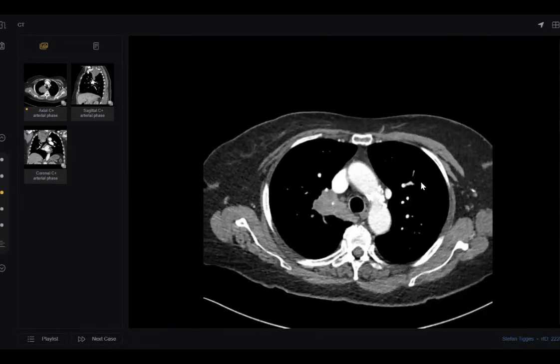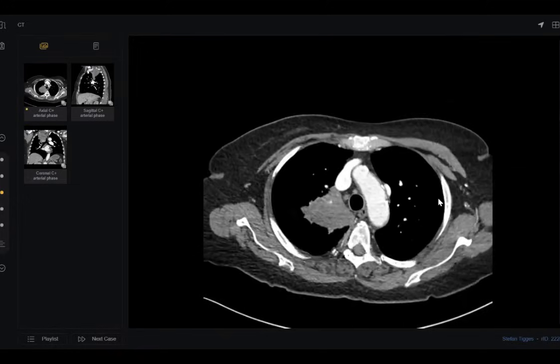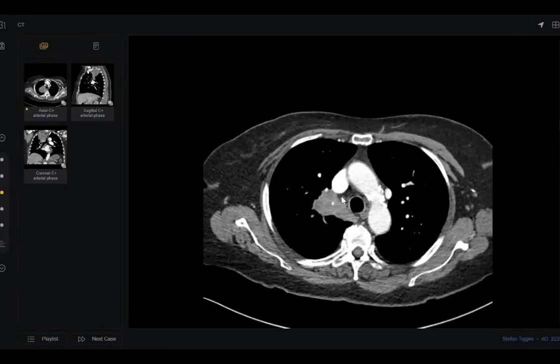So what does it mean for you? Sir, it could be a vascular tumor, sir. No, doctor. It may be a sign of vascular invasion, because look, the tumor totally surrounds and markedly narrows the right upper pulmonary artery, correct? Yes, sir. And if you look here also, the tumor abuts more than 90 degrees.